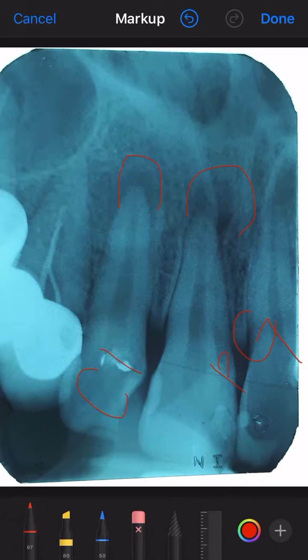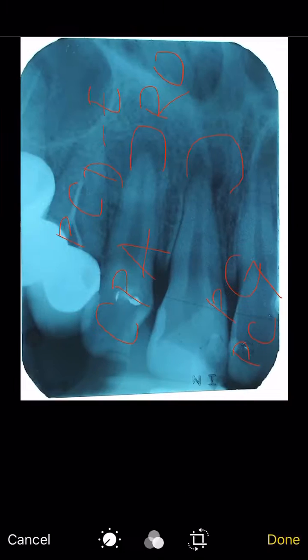Chronic periapical abscess. Now, can you give a differential diagnosis for periapical granuloma? Periapical cyst. Very good. Okay, and what about periapical abscess? Early stage of periapical cemental dysplasia, PCD, early stage, or any other? Rarefying osteitis. Very good. Right? So that is your radiographic interpretation. Thank you.